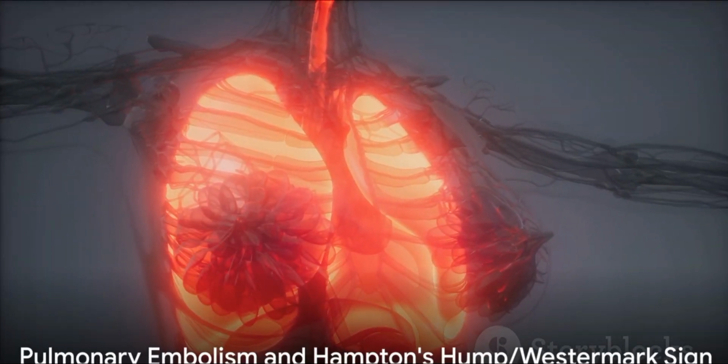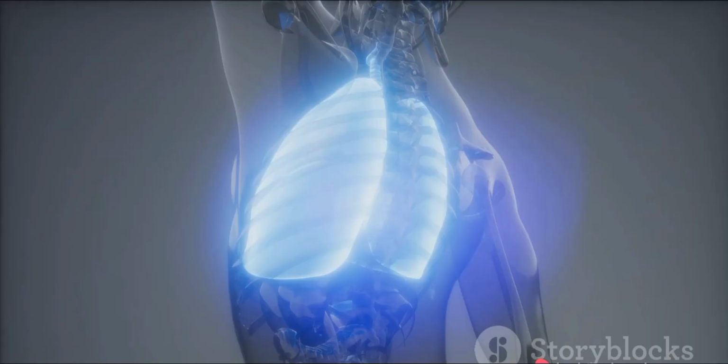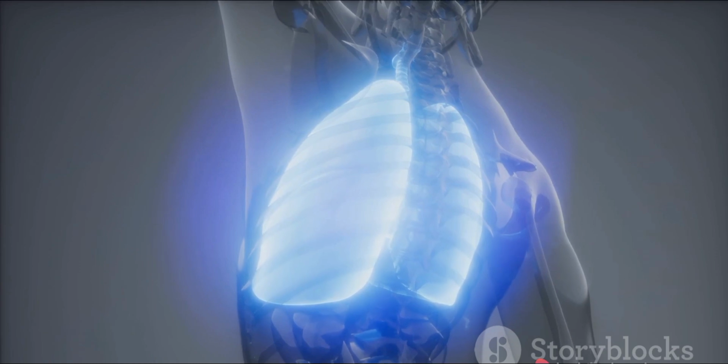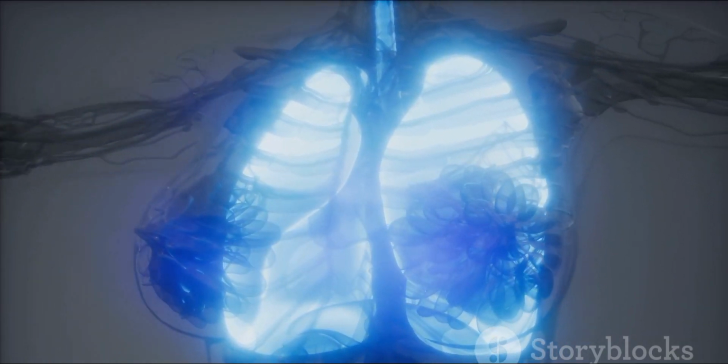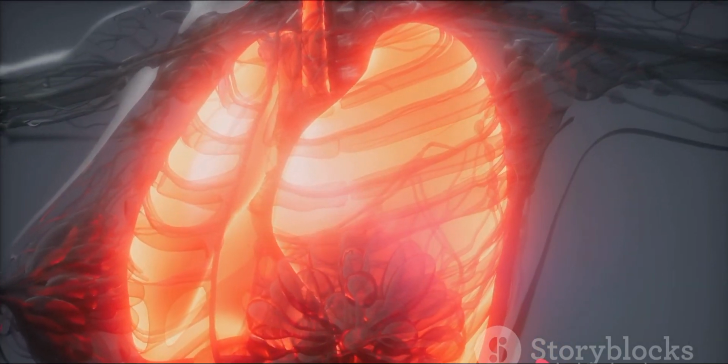Lastly, we have pulmonary embolism, a blockage in one of the pulmonary arteries in the lungs. It's associated with two major signs, Hampton's hump and Westermarck sign. Hampton's hump refers to a rounded shadow at the lung periphery, indicating a blockage. The Westermarck sign is a decreased blood flow beyond the blockage.